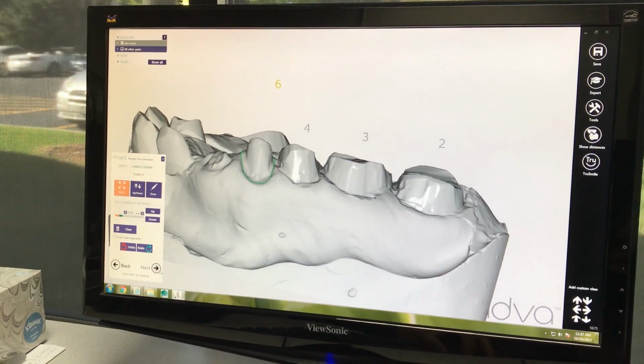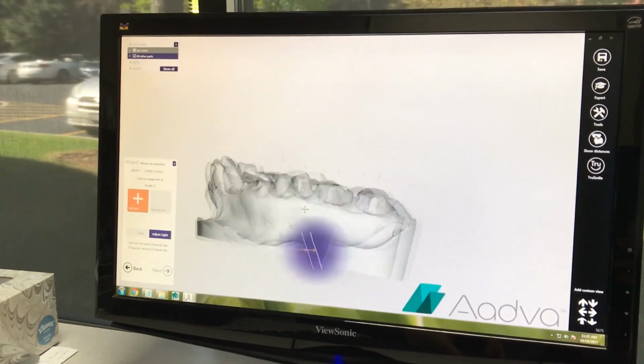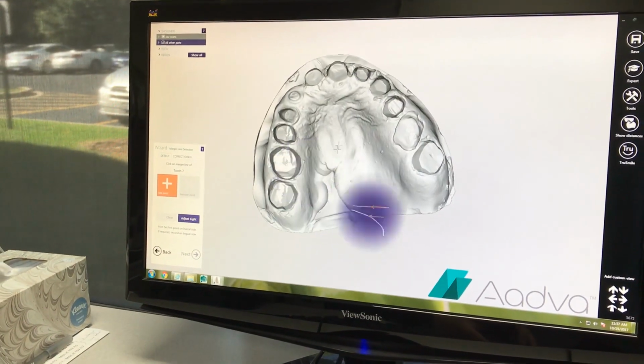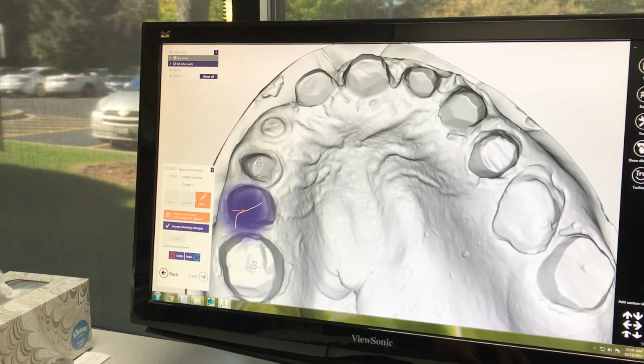So I think Nora, you already did all of the outlining, so that's pretty good. We got a good idea of what it is to make the margins. What do we see once we have everything?